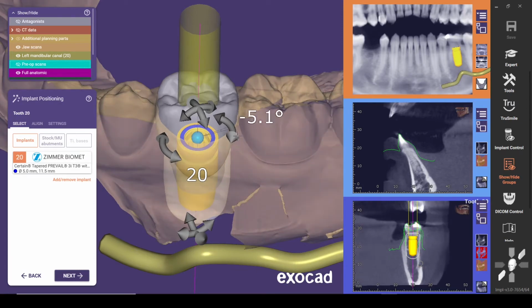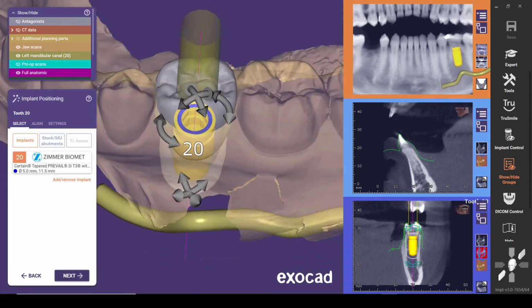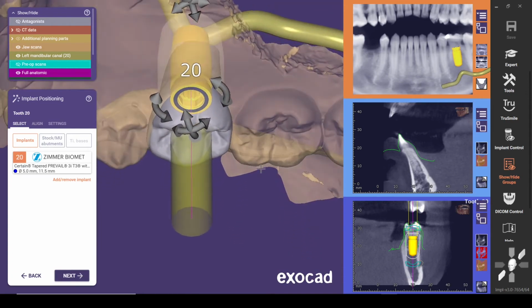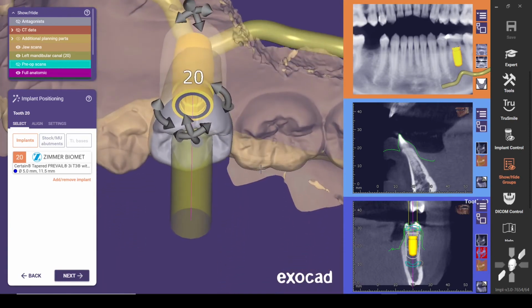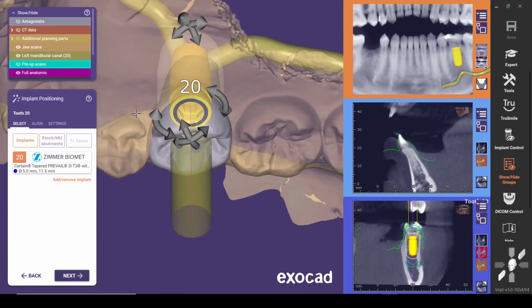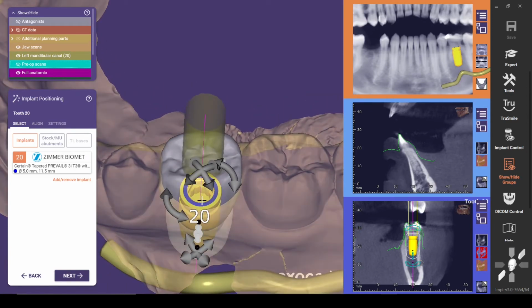So I want to control the timing of the implant by placing the flat part of the hex straight through the buccal and lingual. So you can kind of see it. There's a lot going on this implant. I usually look at it from kind of this view. So you can see this is straight buccal lingual. So again, the surgeon's fixture mount is based on the flat part of the hex.